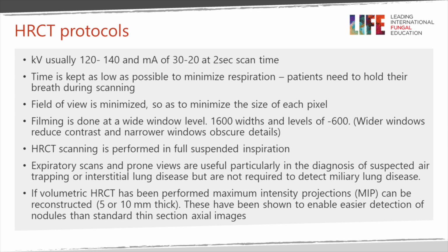I've said we do it in inspiration, and for tuberculosis, prone views and expiratory scans aren't helpful. These are performed looking more for airways or interstitial lung disease.